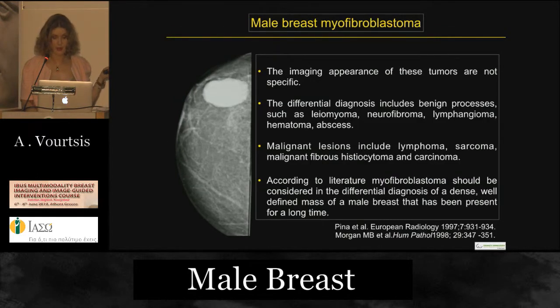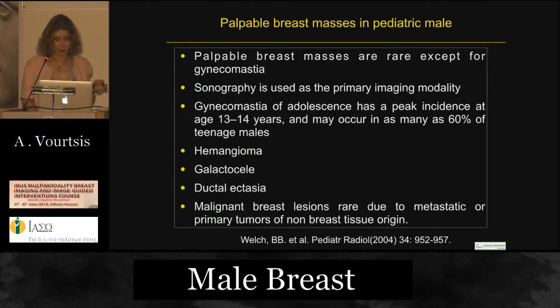So the appearance of these tumors is not specific. We're not able to differentiate these tumors, of course, from male breast cancers, because they're well circumscribed, but we spoke about breast cancer might have similar appearance.